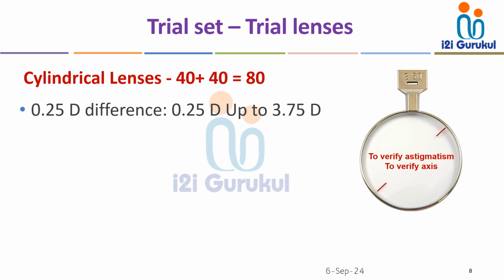Each trial lens set has two trial lenses for every spherical and cylindrical lens power, because sometimes we need the same lens power for both the eyes, right and left.